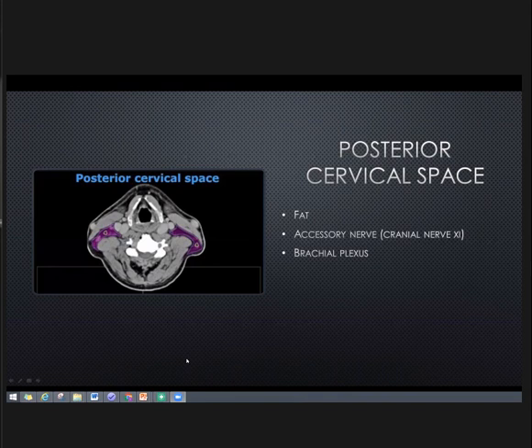It's like your parapharyngeal space below, a fatty structure whose contents are only nerves and lymph nodes. So let's not be confused, because sometimes trainees would point to the muscle area where the lesion is and call it the posterior cervical space. Technically, that's the perivertebral space, no?